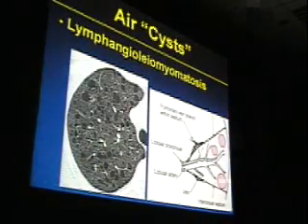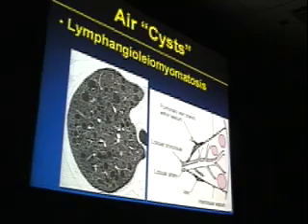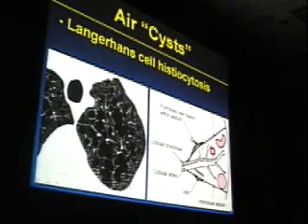Lymphangiomyomatosis, as Dr. Raven pointed out earlier, tends to manifest with relatively thin-walled cysts. You can usually perceive no significant distribution, axial or central, top and bottom throughout the lung. There are usually no other associated findings other than the cysts. You may see pleural fluid, of course, which may be chylous in nature. Here's a patient with cystic lung disease, but these cysts look different from those of patients with lymphangiomyomatosis. These are larger. They're more irregular. They're coalescent into these somewhat linear or tubular shapes, as you see here. And these cysts are typical of Langerhans cell histiocytosis or eosinophilic granuloma.